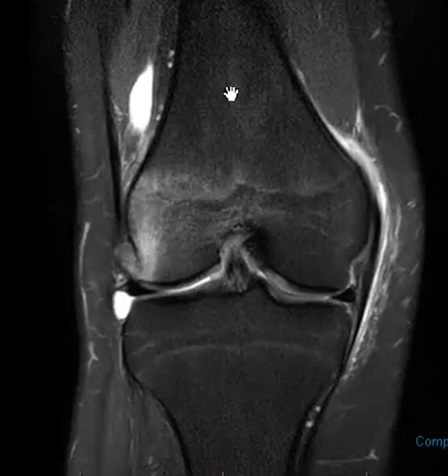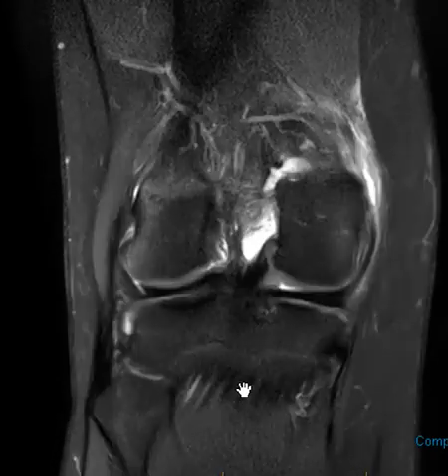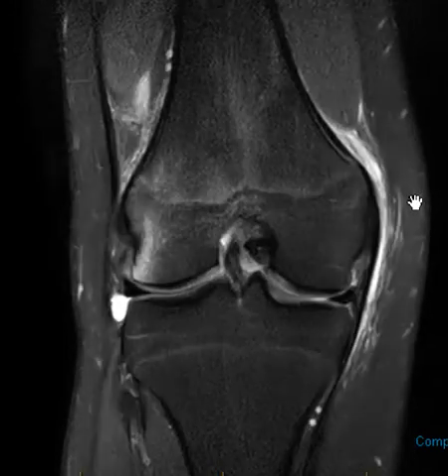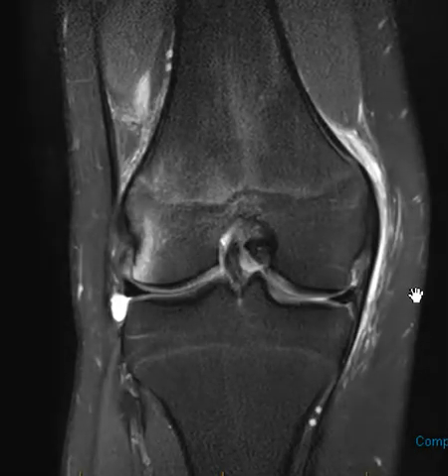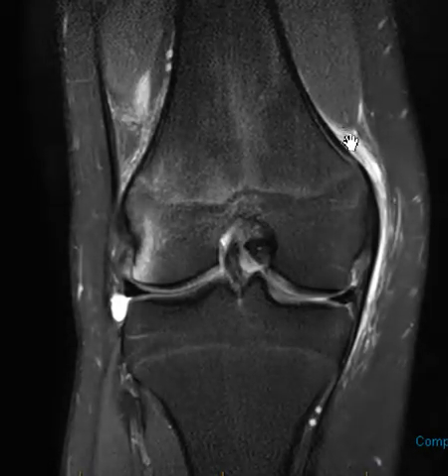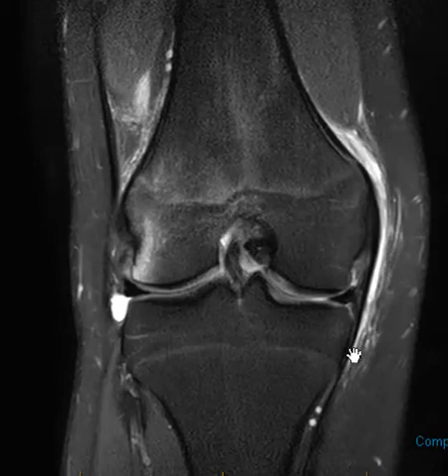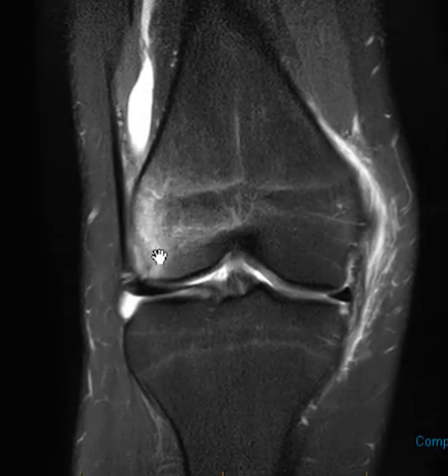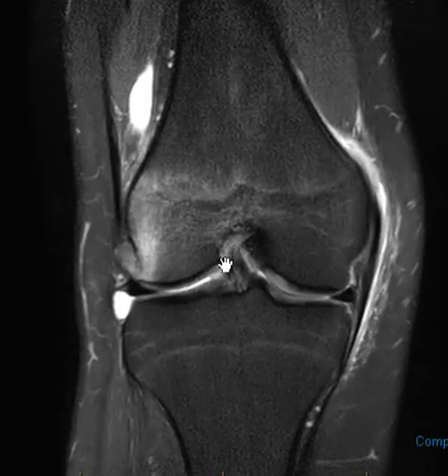You can see the femur up top, the tibia down below. If we go off to the side, there's the fibula to get oriented. So this is the outside of the knee, inside. And a couple findings here that really stand out is this fluid, which is bright over the medial joint line. And we also see something over here on the lateral side. We see marrow edema of the femur, but it doesn't extend beneath the articular surface.